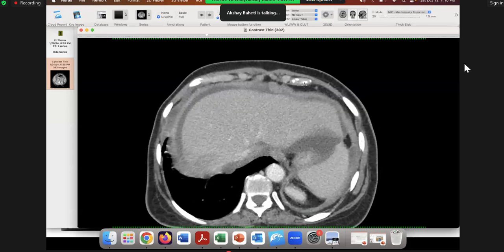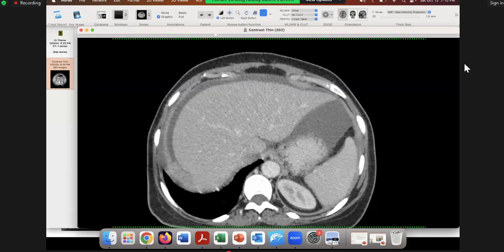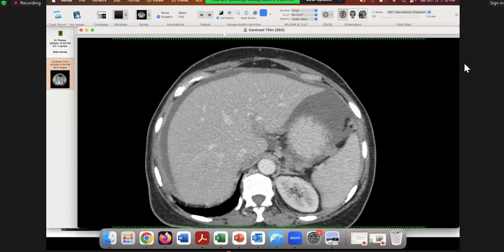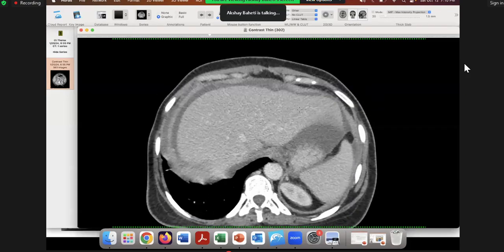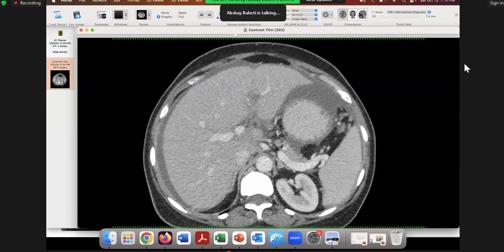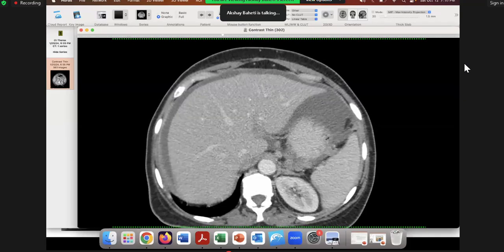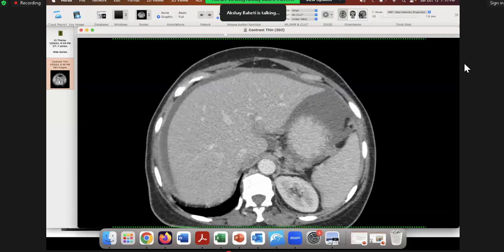Okay, so you can see a node here now. You see this? Yes, sir. Unless you search for it, you won't see them. Okay, with ovarian cancer, we all look at peritoneum very nicely, but we forget that nodes are equally common, or almost equally common. Maybe peritoneum is slightly more obvious, and they are big, but almost half the ovarian cancers will have at least micrometastatic nodal disease, if not more.